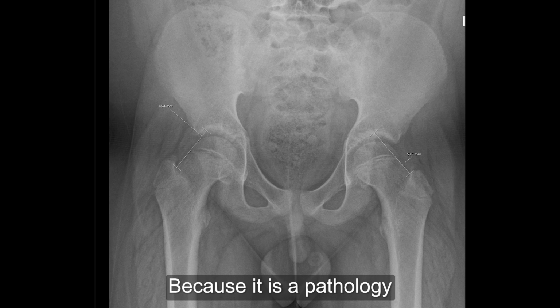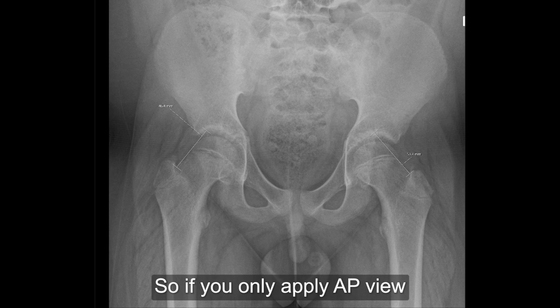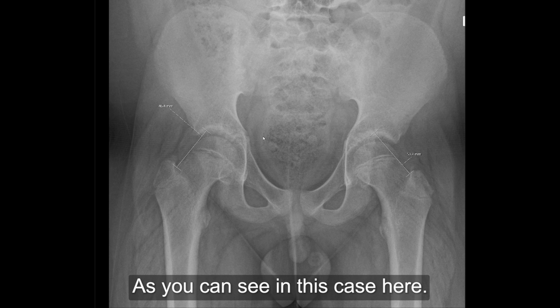And something we need to point out, why do we need to look at two views, is because it is a pathology that is better and more easily seen on the frog lateral position than the AP view. So if you only apply AP view, you're reducing your chances of picking up subtle signs of slipped femoral epiphysis, as you can see in this case here.